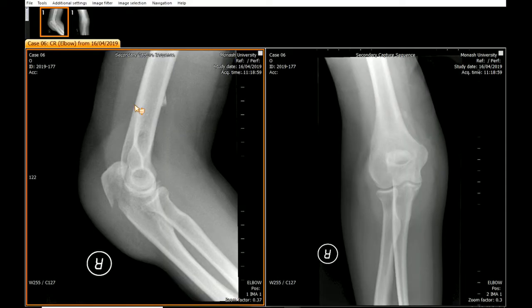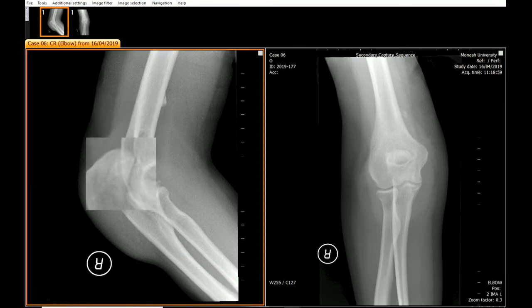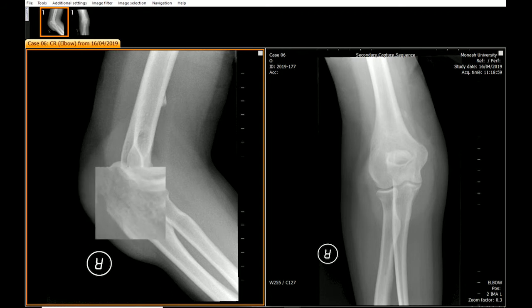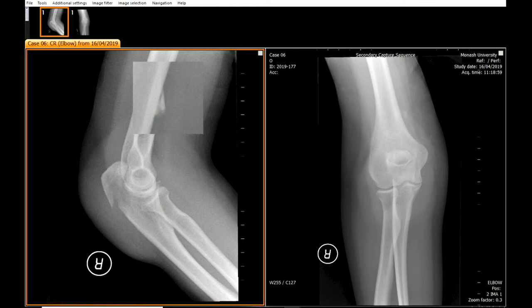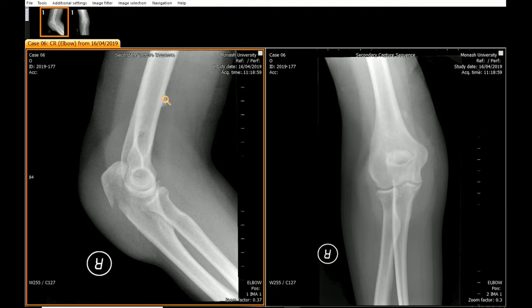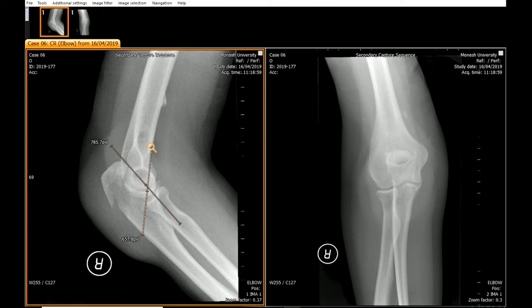Case 6 is a patient who had a roller skate injury to the right elbow. So here we can see again there's a fracture of the olecranon. There's multiple lucencies, which indicates that it's a comminuted fracture and it's also intra-articular. Interestingly, there is a humeral spur. This is a normal variant. If we again check to see if there's any dislocations or subluxations, this is all normal. And there are some soft tissue elevated fat pads as well.